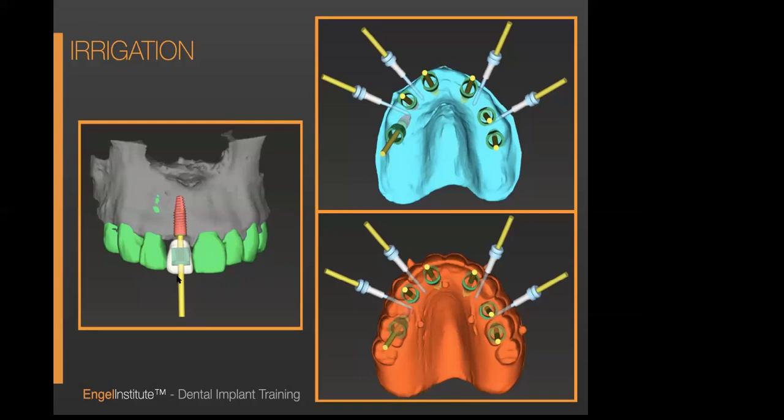And what do you think happens with space when the patient is missing the tooth? Yes, you've guessed it right, it closes up, right? So as you could see, this white tooth is much smaller than this green tooth. So what we decided was that we wanted to try to make the 2 front teeth even.